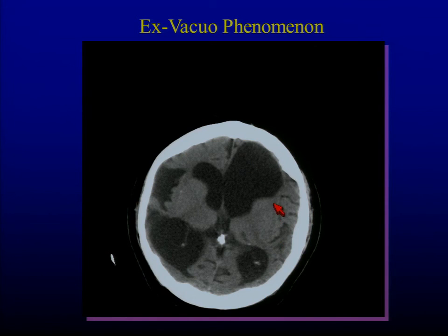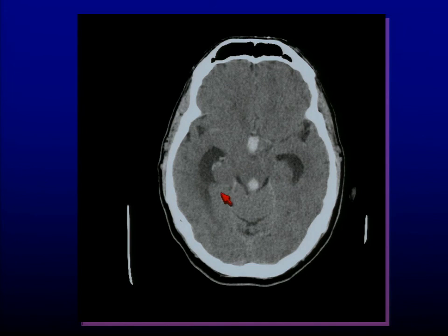I need the other information to tell me, is this an acute hydrocephalus, a too-much-pressure problem? This kid just has a lot of water and not that much brain. So this is not an acute, oh my gosh, problem. This person had, presumably, an anoxic injury or something, and they have loss of brain in favor of water. And then there's the temporal tips, kind of in the early warning stage.